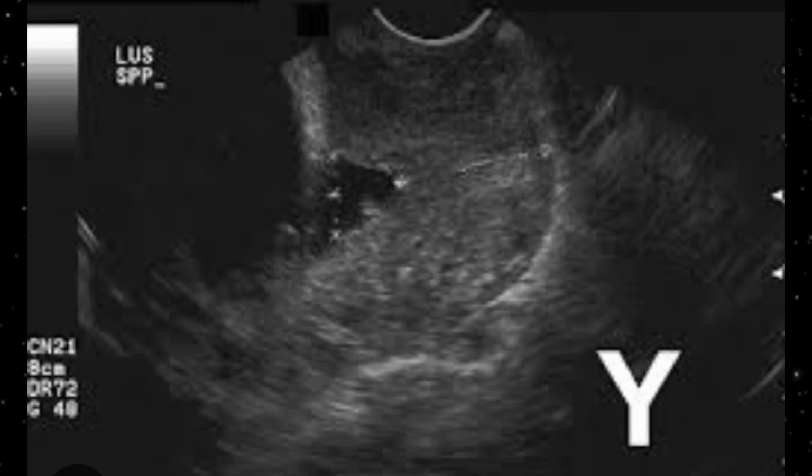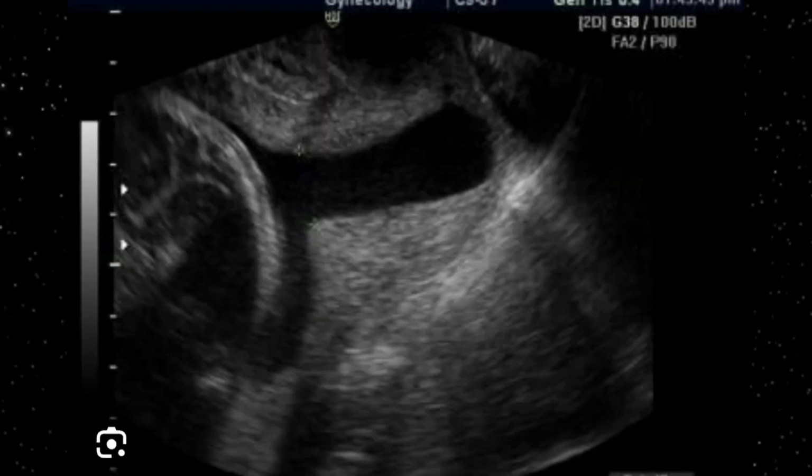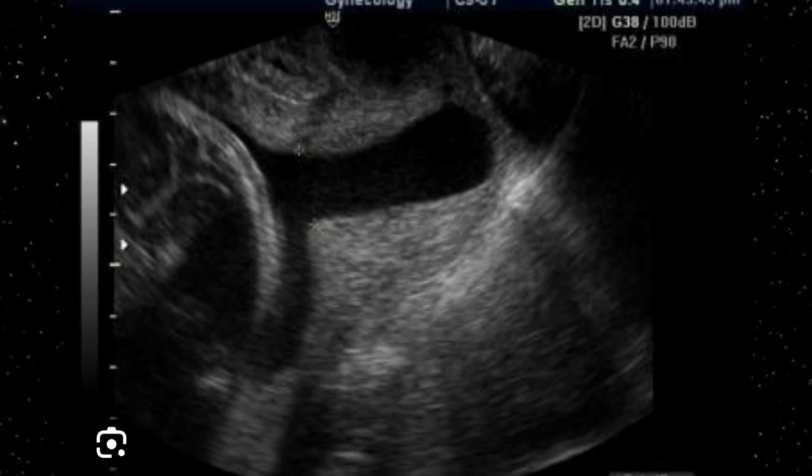So what your report would be: a transvaginal scan is performed, cervical length measuring whatever the measurement, cervical width is measuring this and that, and internal os is seen dilated up to 6 millimeter, suggestive of cervical incompetence, and further management is suggested. Another point in that case is that most often the gynecologist prefers to put the patient on a follow-up scan, for example after 2 weeks or 3 weeks. If the dilatation still persists, they put the patient on further management. This is a very clear-cut example of cervical incompetence.